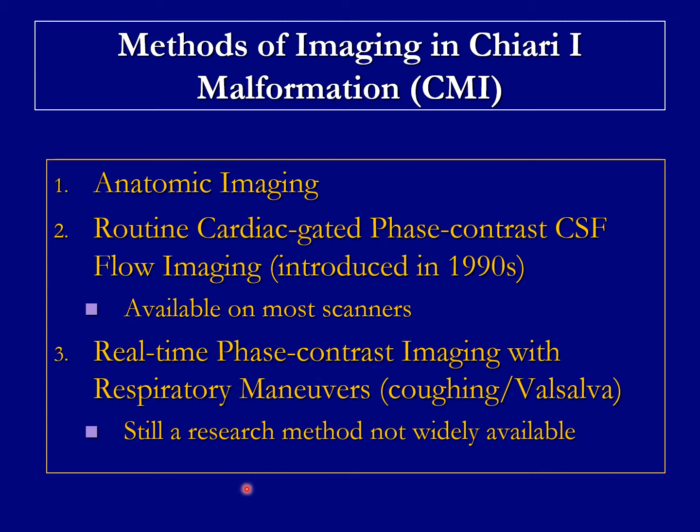A routine cardiac-gated phase contrast, which I mentioned we have used since the 1990s, is available on most scanners, but we found that it is not as sensitive as one would expect. To improve on that, we developed what is called a real-time phase contrast imaging technique, which can be used while the patient is in the scanner and can cough or do Valsalva, so that we can assess in real time the changes of the CSF flow with that response. It is still a research method, not widely available.